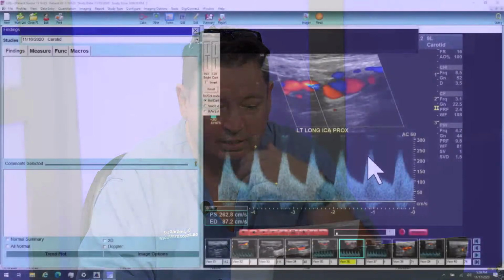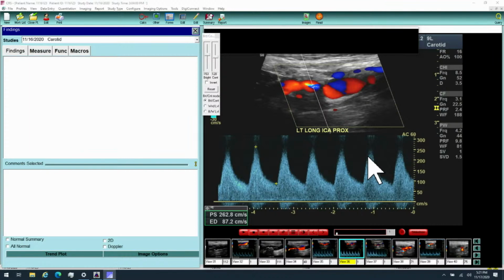I see. The most difficult interpretation, I think, is on the right side, because it cannot be a coincidence that your right subclavian has the minimal flow and your right vertebral is reversed. So I think the retrograde right vertebral artery is the other easy interpretation. And in your report, you beautifully did bilateral blood pressure, and I think that's a very important point, that in our protocol and on our report, we're going to display the bilateral blood pressure. The right side was 82, while the left side was 159.